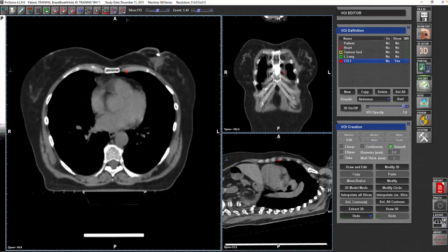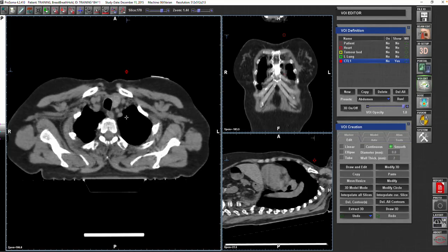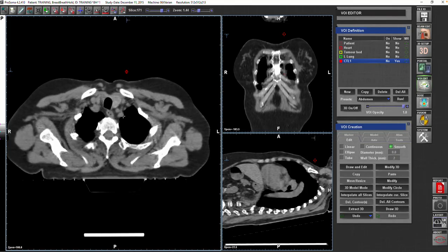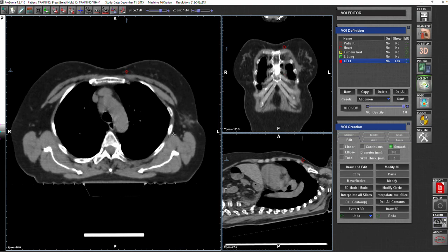So what we said so far is nothing except to familiarize ourselves with the subclavian artery, subclavian vein, thoracodorsal vessels, internal mammary vessels, pectoralis major, pectoralis minor, and finally the fourth rib. So the next will be to show you a very simple method of target volume delineation thereafter. So this will be the second part of the breast cancer delineation.